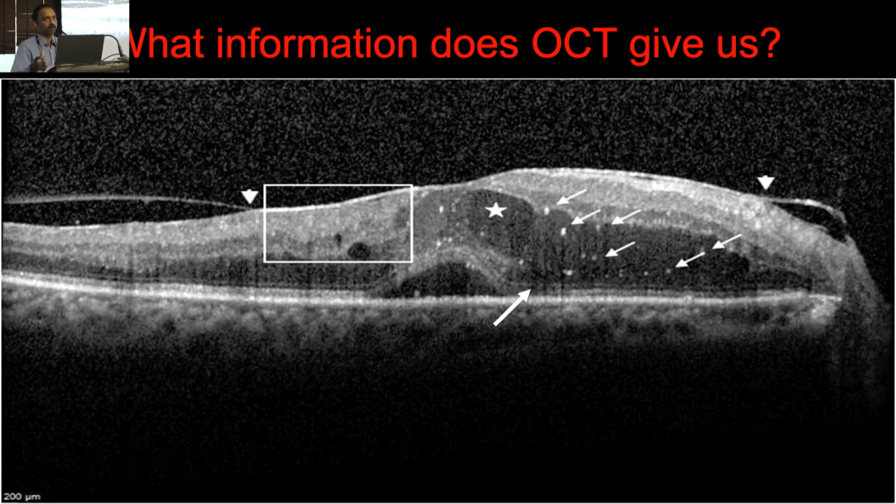Basically, we are trying to look at the macula, which is just a manifestation of the response of the retinal vein occlusion or the retinal arterial occlusion. And we are trying to look at these various features on the OCT. Increased retinal thickness. We are looking at fluid, intraretinal fluid and subretinal fluid. We are also looking at hyperreflective foci within the retinal tissue, and vitreoretinal interface changes. We are trying to see how the inner retina is, whether it's opacified. There could be disorganized retinal inner layers, which is called DRIL. You could also have disorganized retinal outer layers, like loss of ellipsoid zone.